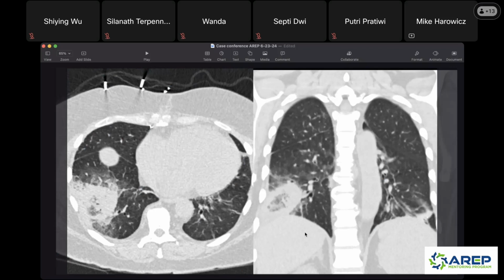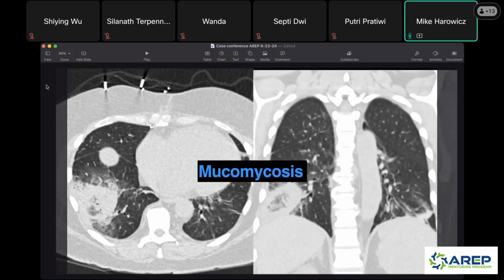And this is a tough one. So when I see this look in someone who's immunosuppressed, it looks sort of like an infarct, but it's very big. I worry about fungus that is angioinvasive. So the ones that I'm specifically worried about are what this turned out to be. Just trying to go to the next slide. There we go. And that should say mucor, not muco. Mucormycosis. And you can think of angioinvasive aspergillosis, right?